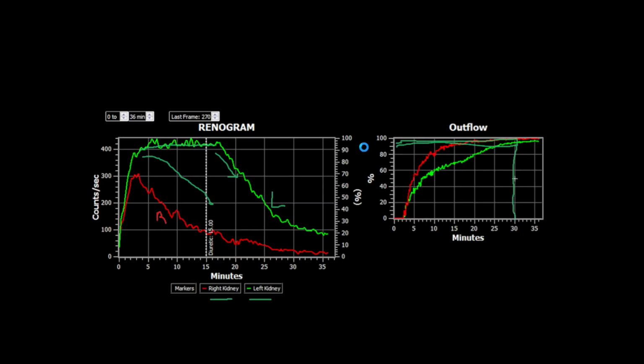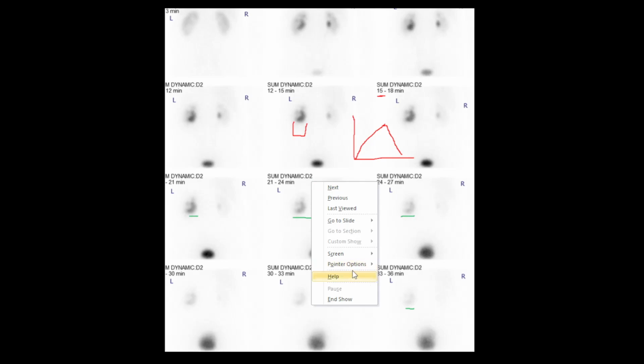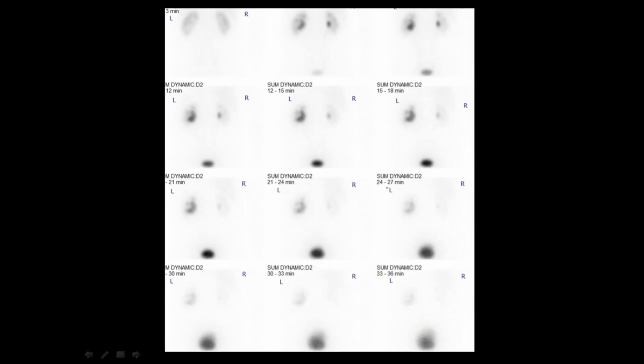And this is the classic question that you're asked in MAG3 renography. This patient's got a big renal pelvis, big pelvic calyceal system. Is it obstructed or isn't it? And here we have what's essentially a capacious or baggy collecting system, which is clearing in response to the diuretic. So this means that the patient probably doesn't require any intervention.